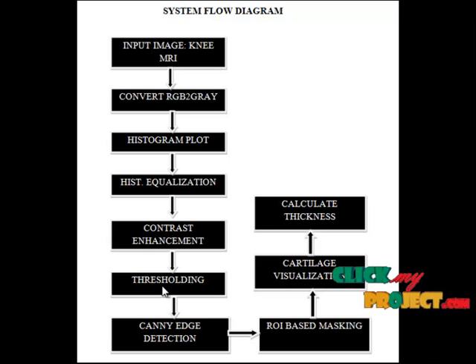Then this binary image is given to the Canny edge detection method. Masks are developed by fixing the points on ROI polygon edges in images or areas with strong intensity contrast. Edge detection significantly reduces the amount of data and filters out useless information while preserving the important structural properties in an image. In our project, we use the Canny edge detection method. By using the Canny edge detection technique, boundaries of the femur and tibia are obtained.